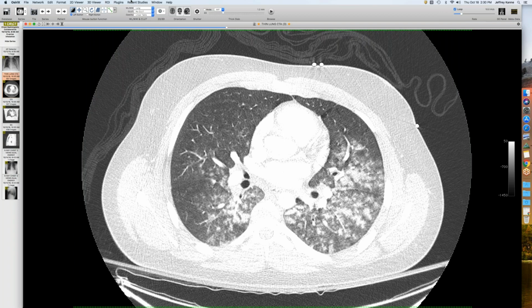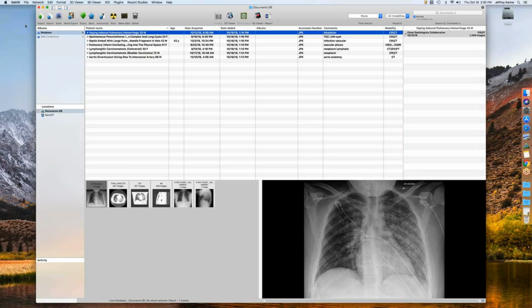So, you know, pulmonary hemorrhage is classically crack cocaine. That's a big cause of hemorrhage. Right. But it wasn't his. Yeah, no, he was forthcoming with what he took. It was marijuana on occasion, and then really it was sort of a big time vapor. This is the first vaping one I've seen, but I can't figure out exactly what he had.